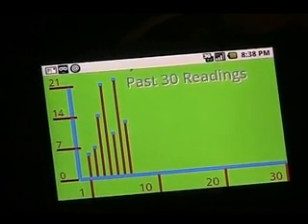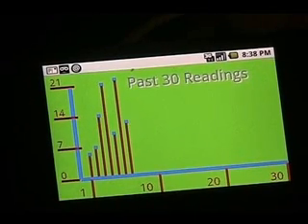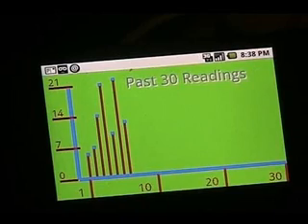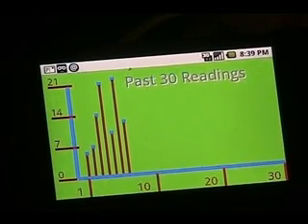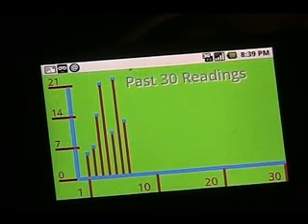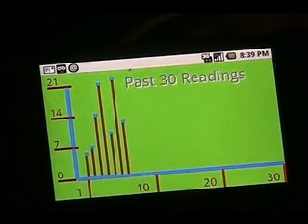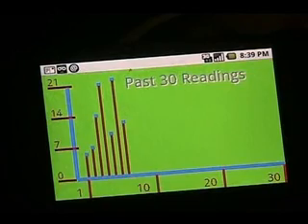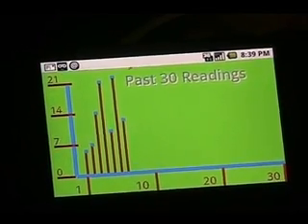And for you programmers out there, the level is actually kept in a text string, but I convert it to a decimal type number, and it enables it to do it with a decimal point. And that's about it. The data input is a little different.